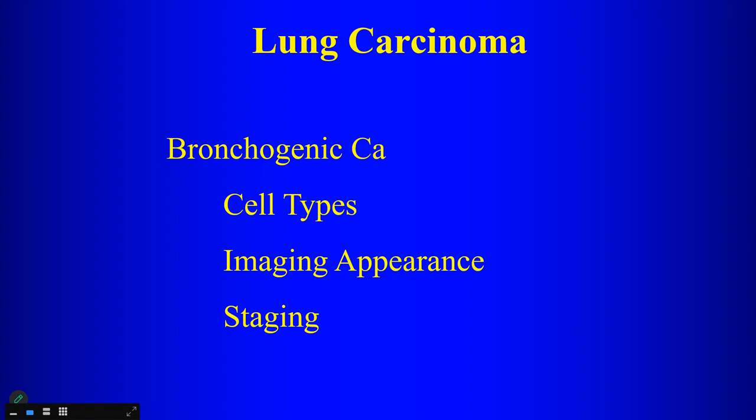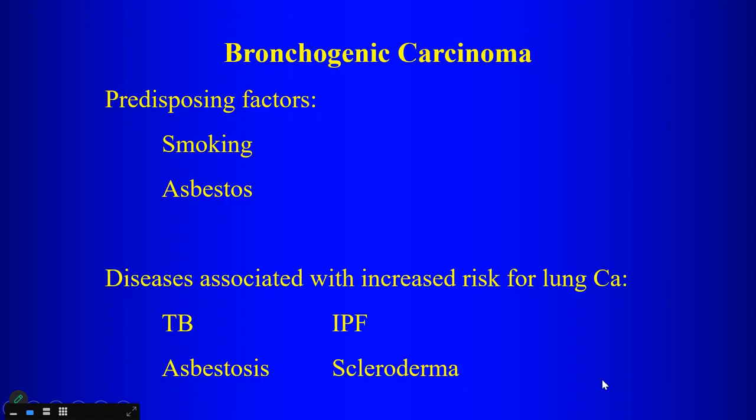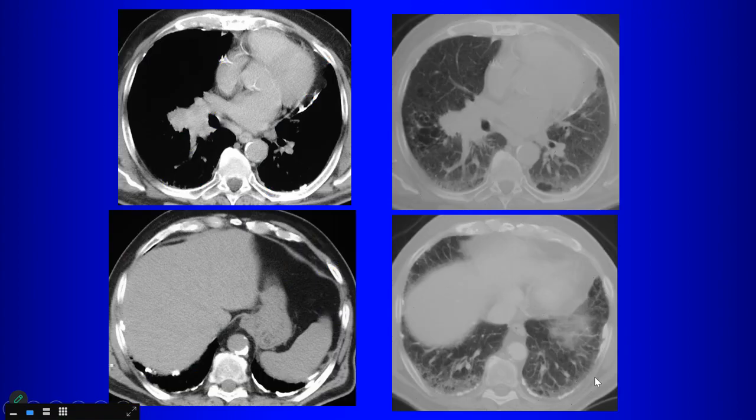Okay, so today we started a discussion about lung cancer. And when we look at this CT scan, you see that there's an obvious mass here on the right. Okay. And of course, the lecture is on lung cancer, but what other findings here would increase your suspicion for lung cancer in this patient? Emphysema? Right, so there's emphysema.